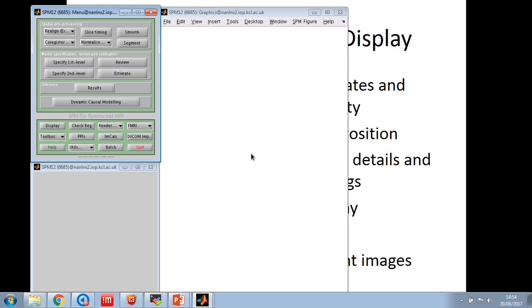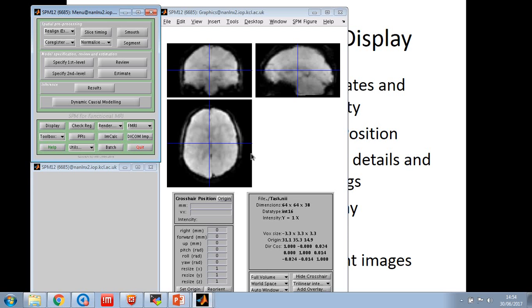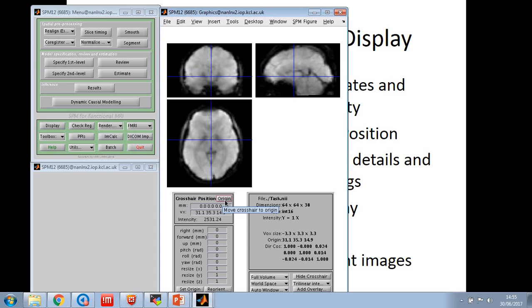And what you'll immediately see, hopefully, is that the image is much blurrier, much harder to tell the location. The key thing is it doesn't have to be perfect, it just has to be roughly in the right location, right area. And actually, I'm going to move a little bit further forward, but not much, just to demonstrate. So actually, this isn't far off. Ooh, come back medially. Okay.